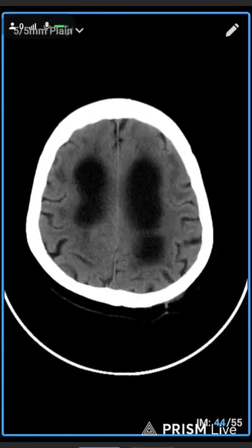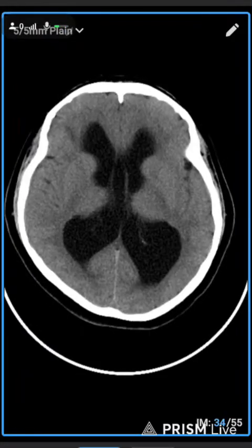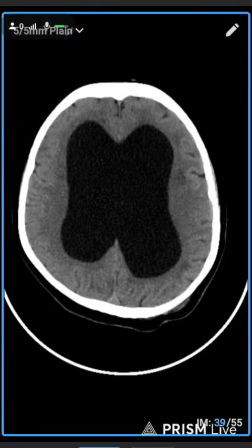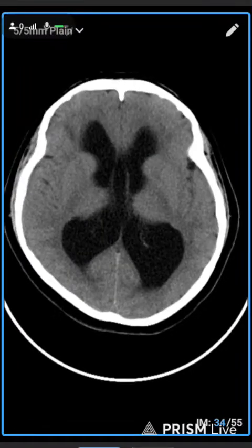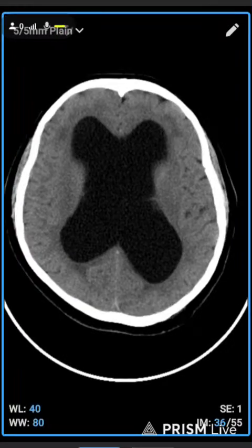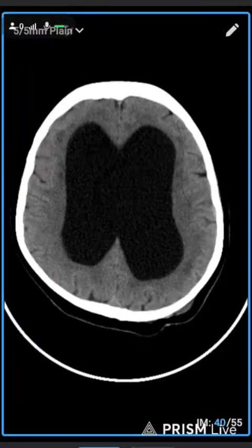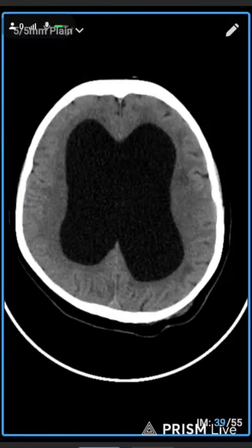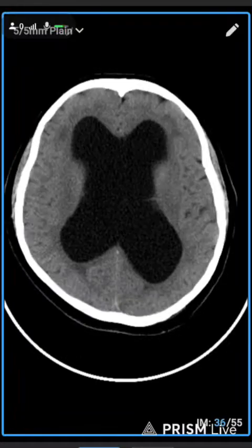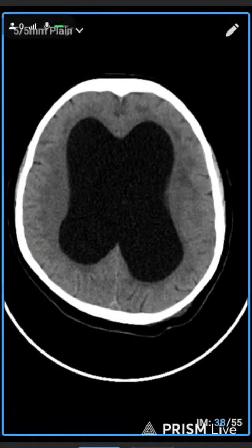In most of the cases, the baby's brain looks like that. If you see lots of babies, their head is larger, so the brain of these patients has hydrocephalus. It means the CSF flow, the CSF would flow through the brain to the spinal cord.